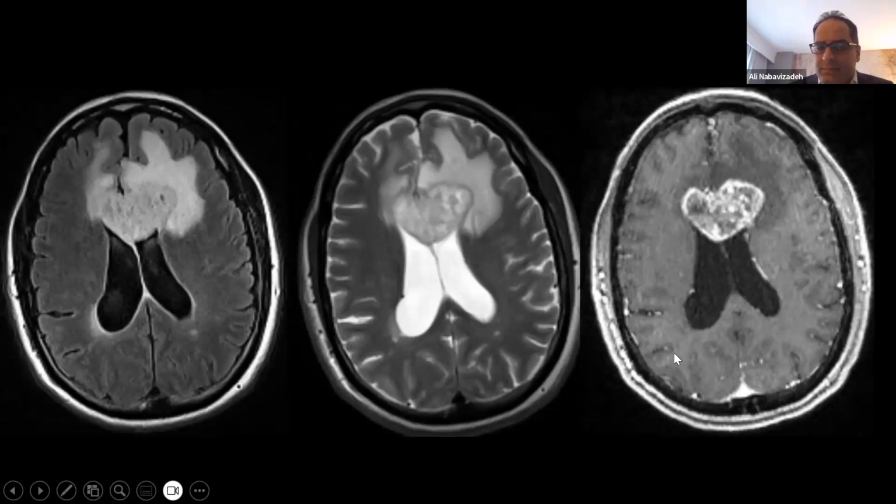And this is a patient with glioblastoma in the genu of the corpus callosum. By looking at the contrast-enhanced MR, we can certainly indicate that this patient has disruption of the blood-brain barrier. But that's as far as we can tell. If you want to quantify the tumor neoangiogenesis, tumor vascularity, and the degree of blood-brain barrier disruption, we have to do some sort of perfusion imaging.